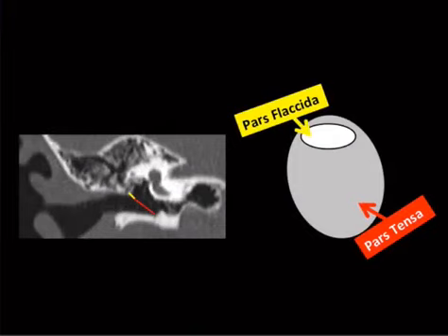The tympanic membrane. Remember, finger in the ear, just to orient you here, fingernail, crazy looking triangle finger. And here's the TM. The TM has two parts to it. It has a floppy part, the pars flaccida, and a tense part, the pars tensa. Just remember the floppy one is the more vulnerable one.